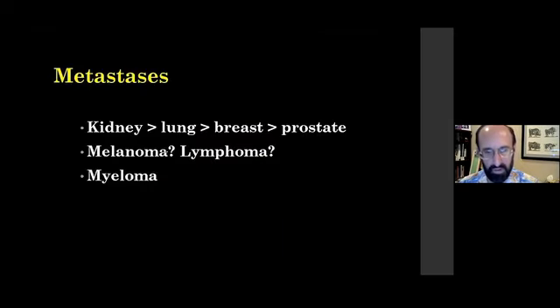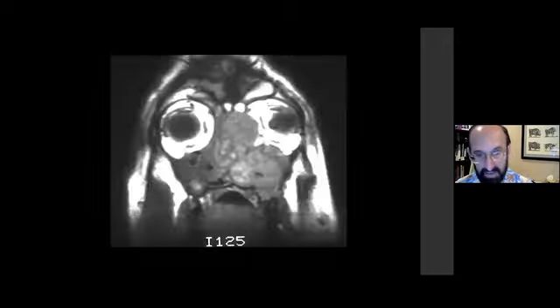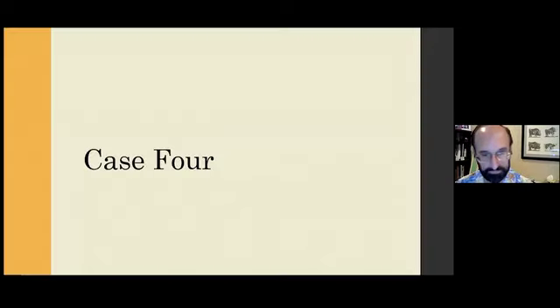And one thing to remind you is that some of the metastases to the sinonasal cavity may be hemorrhagic and therefore be bright on T1 based on the hemorrhage. And those include the kidney, and melanoma from the periphery may be metastatic to the sinonasal cavity. This was a patient who had bright signal intensity. This was a kidney carcinoma metastasis to the sinonasal cavity that had hemorrhagic metastasis, and the bright signal was not due to melanin, but due to the hemorrhage.